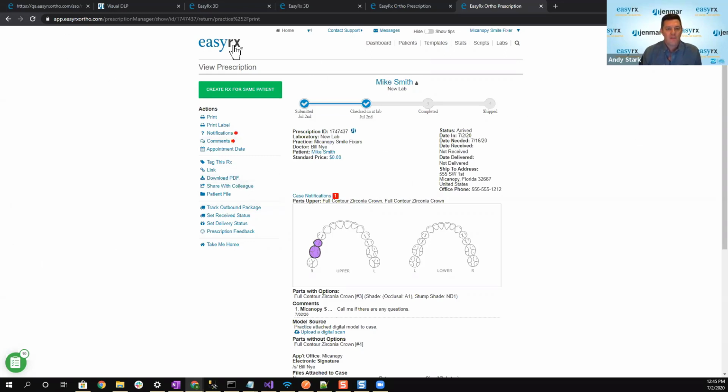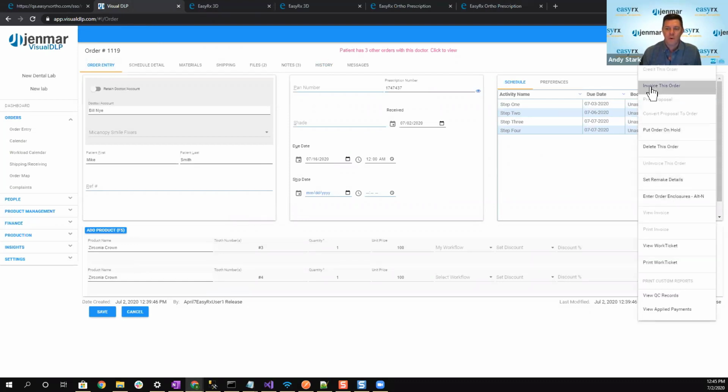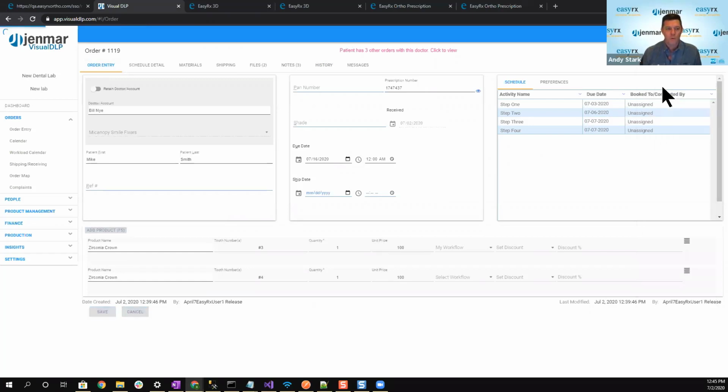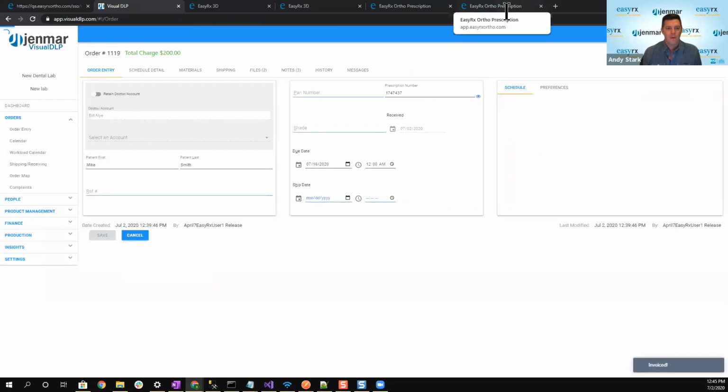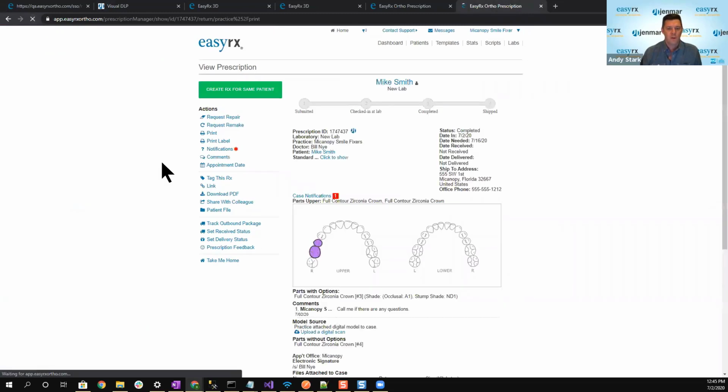All right, so now this case has been submitted. It's in production. Let's say we come through now, and as I mentioned, there is another touch point back into EasyRx: when you invoice this order, when it comes through production, comes back up for billing, we invoice the order. Case is now invoiced for $200. Refresh on this side, and you're going to see that it's been marked as complete.